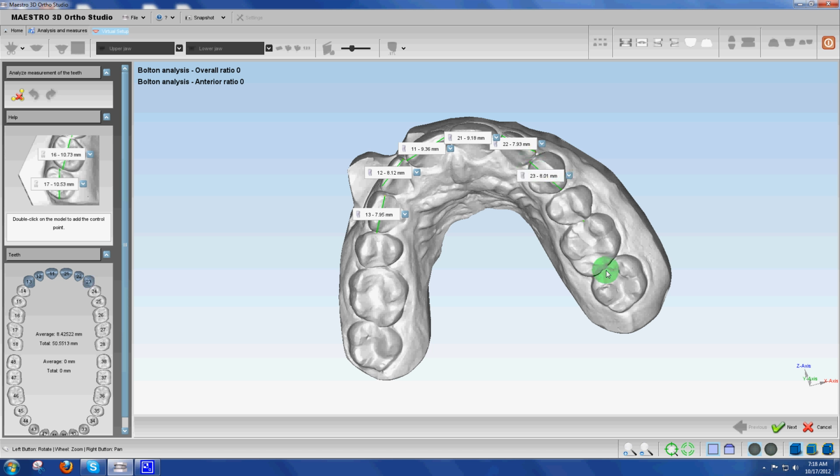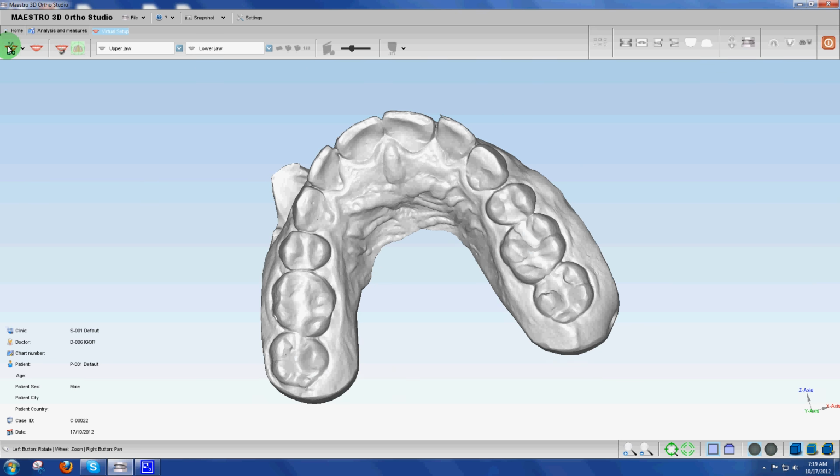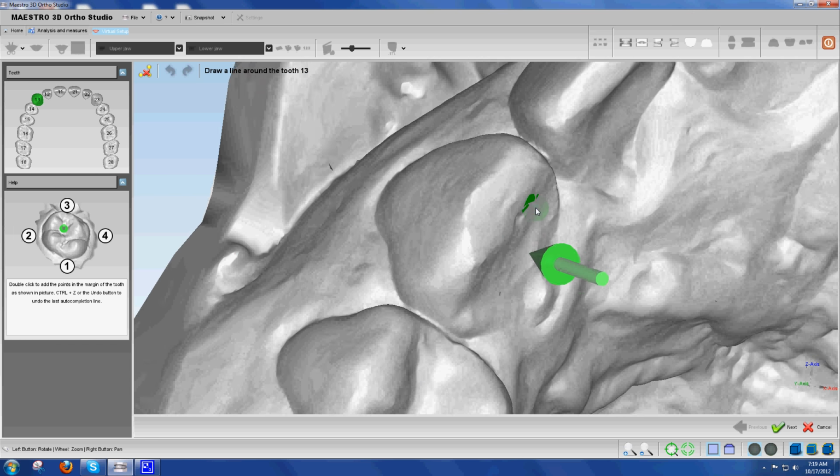And this tooth obviously is going to give us a little bit of a problem, as once again the software makes certain assumptions that this tooth follows that tooth, and it assumes it is a 24, and in fact it is not. It is a tooth 2-6. So that defined the teeth. Now my next step will be to accept that, and we go into the definition of the individual teeth.